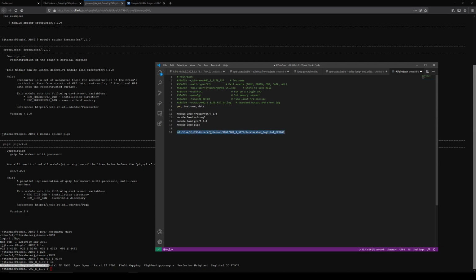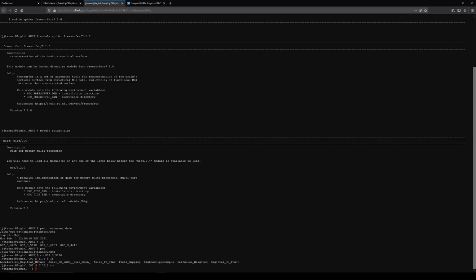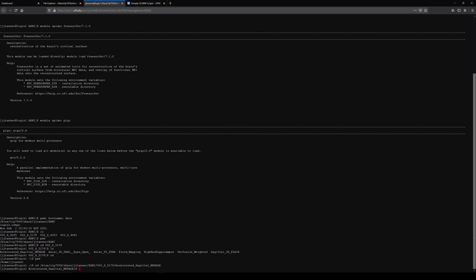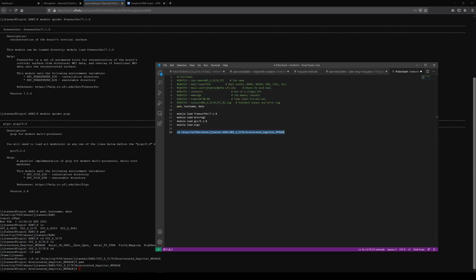If you want to test it, you can. So I'm going to copy that just to make sure this works. I'm going to cd and say nothing and enter. So I'm home, which for me is home/JJ Tanner. Now I'm going to paste in that command, and we'll see if it works. It didn't give me an error. I'm there, I've verified that that worked. We didn't really have to do that, but again, we're sort of debugging the script as we go.